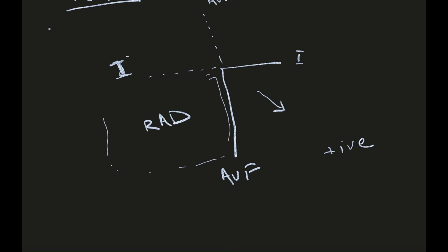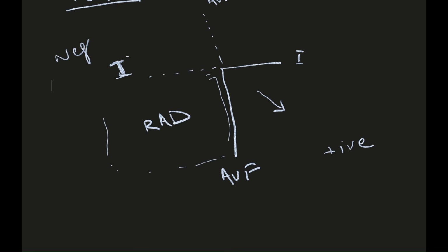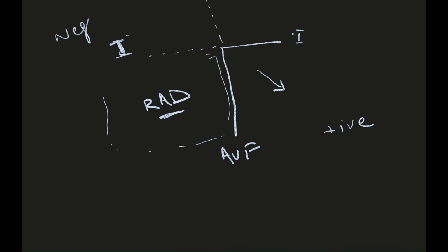And this whole section of lead 1 is negative. Now, if your axis lies over this region, it comes towards the negative end of lead 1 and stays on the positive side of AVF.